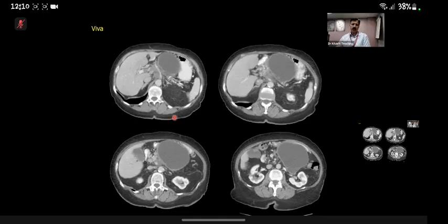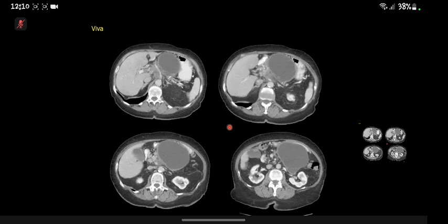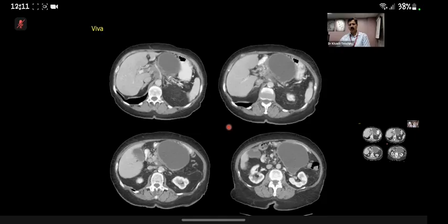And basically, it's a very good learning case. What happens is that we missed it. There is a scan which I'm not showing you, which was about 7 months prior to this one. Similar findings, closer, now these are more blatant. Basically, there is a cystic lesion. And how did we report it? We just reported that this is a cystic lesion. Is there any history of previous pancreatitis? Because the reporter thought or raised the issue that this might be a pseudocyst. Actually, then it was missed.